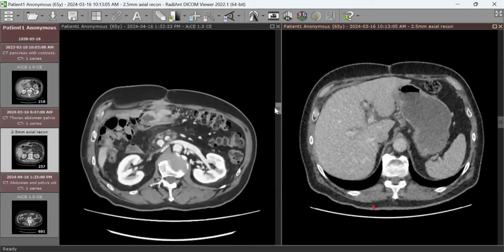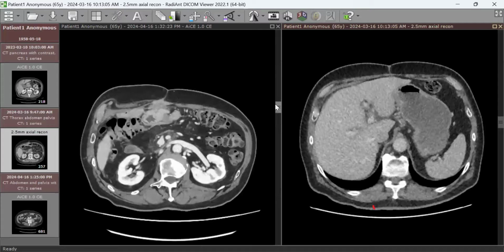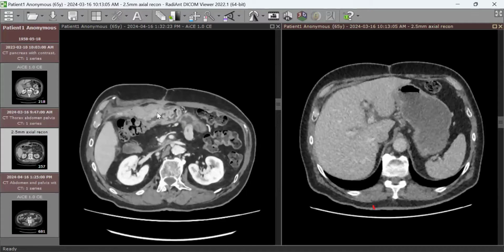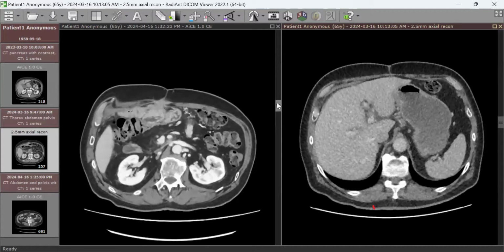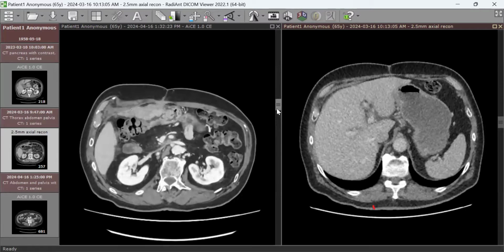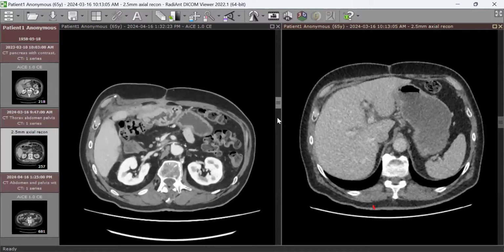Exactly, sir. I agree with you. The obstruction is at the level of gastrojejunostomy, but this lesion is right at the site, and there is thickening in the wall here. And this could be, if not mechanically causing the obstruction totally, because there's still some fluid passing, it could be functional. If the involvement of the wall of the jejunum or distal stomach is paralyzing the nerves, it could be functional paralysis because of the invasion of the wall and nerves there. So that could be one reason, in addition to mechanical pressure from the tumor.